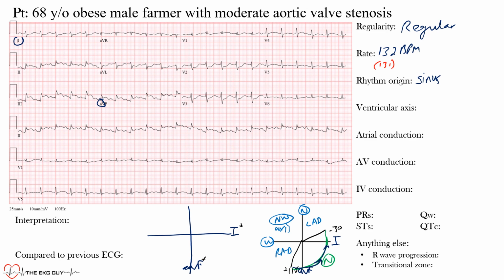So what you want to look here is we'll look at lead 1, okay? So lead 1 up here, and we're pretty much taking this baseline, oops, it's a little above that actually. I've kind of showed the ST segment, but here it's a little higher, okay, from there. And you're measuring the difference, pretty much, if you have this complex, between this and this, okay? Is it mostly positive, meaning above the baseline, or mostly negative, okay? In this case, it seems like it's almost isoelectric, meaning that it's almost the same above and below the plane, okay? Maybe a little more negative or so, but I would say mostly isoelectric.